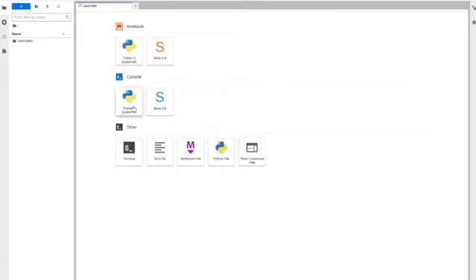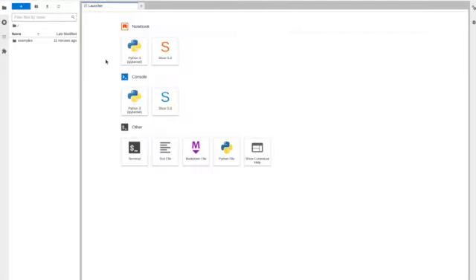It essentially is your typical JupyterLab environment if you're used to seeing it. One thing you'll notice that's different is you have this Slicer icon right here. It's open source software, but it essentially gives you all the features of 3D Slicer, available inside of JupyterLab. You can also access it from the console, and then you have all these other features. If you did want to open a terminal and install additional packages, you could as well.